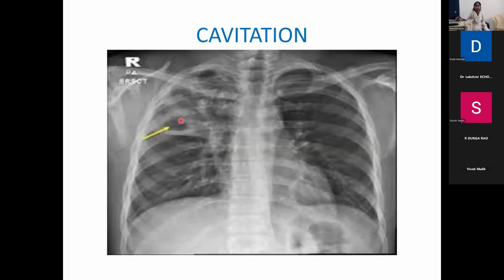This is very typical and characteristic of tuberculosis. Okay, so what do you see? There is a consolidation, but inside the consolidation, what is happening? There is necrotic breakdown, and it is going to form a cavity. Cavity here, cavity here, cavity here. So these are signs of cavitation mostly in the upper zones. Here it is the right upper lobe because you can see the minor fissure. So this is very characteristic of tuberculosis.